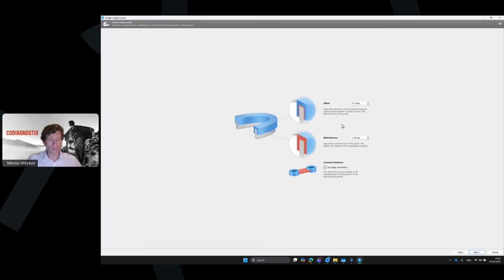Mostly I am working with a calibrated good printer with 3D objects as I designed, and I don't have a scan of the object, I have a 3D model of the object, and I put it virtually before. So in these cases, I use a small offset.